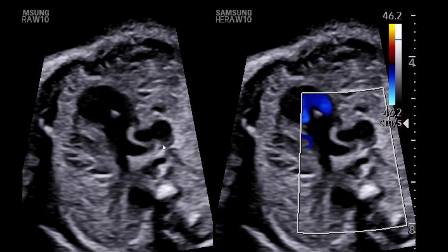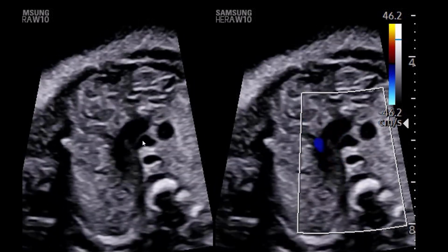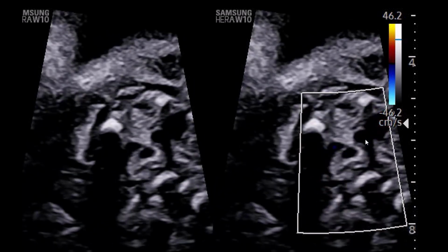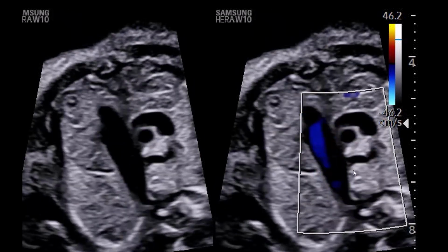And then here we have a nice slowed down axial upper chest view, three vessel view shown here: SVC, aorta, and pulmonary artery bifurcation again. And then as we put it in motion, you can see the ductal arch, ascending aorta here, and then the bifurcation of that vessel at the top of the sweep.